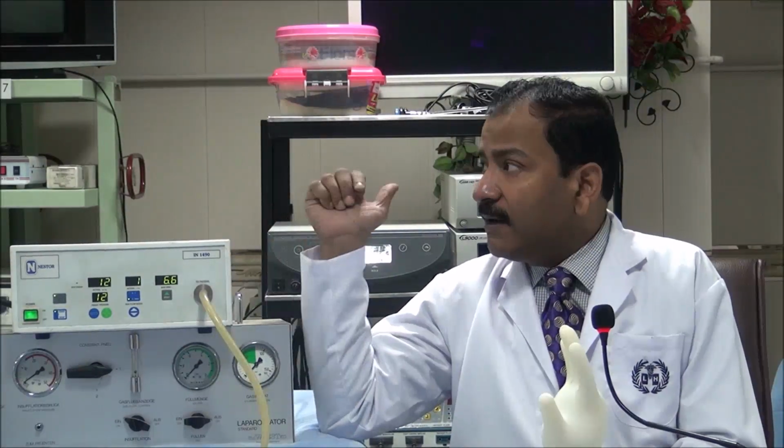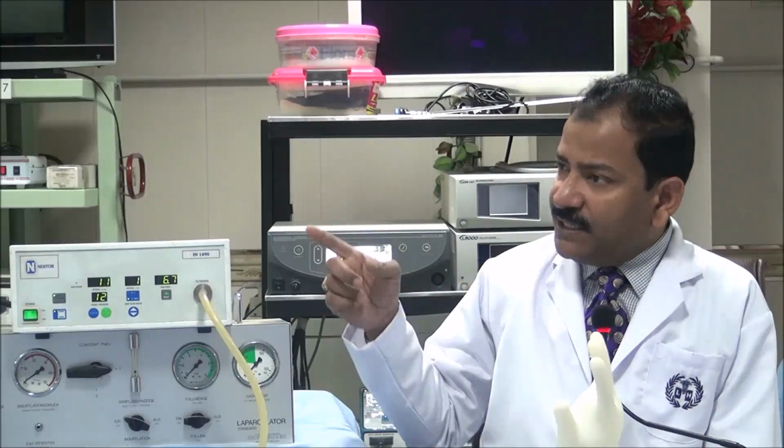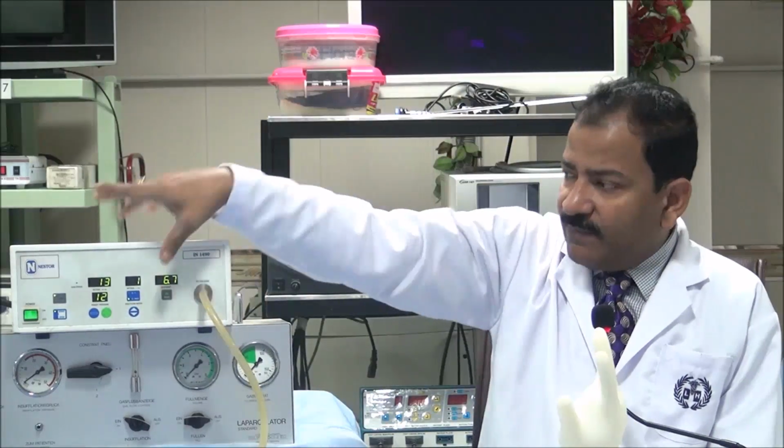Now sometimes what happens, when you are using the Stryker insufflator, there is no automatic 0 to max or 0 to 1. They have manual adjustments. If you have seen, there is a bar, a longitudinal light, and there is plus minus.